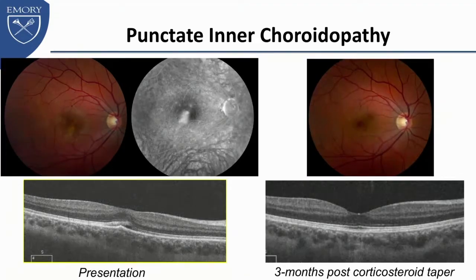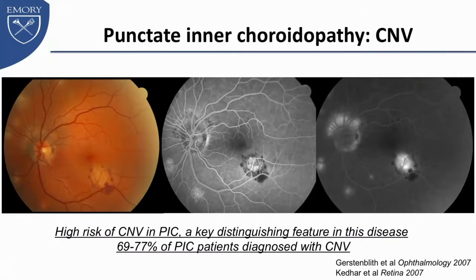And you can see that post-corticosteroid, we followed her with serial fundus photography and OCT. She deferred further fluorescein angiography at that point, and you can see her lesion has nicely resolved with treatment.